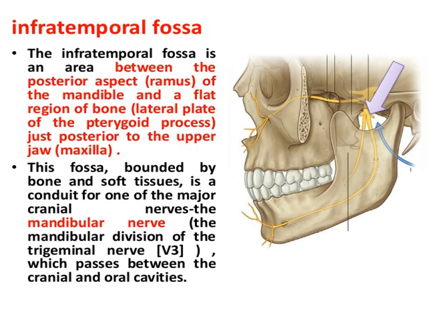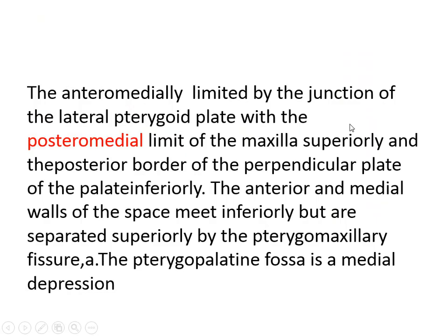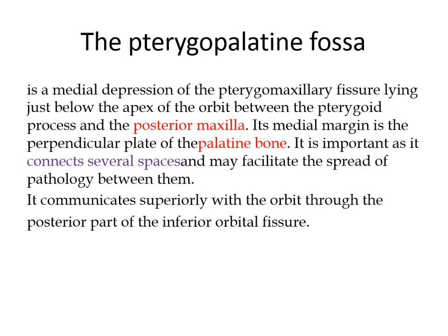So if I tell you to find the infratemporal fossa on axial images, you look for the parotid gland, you look for the deep lobe, and go anterior to it. Or you look for the maxillary sinus, look for the posterior wall, and go posterior to it.